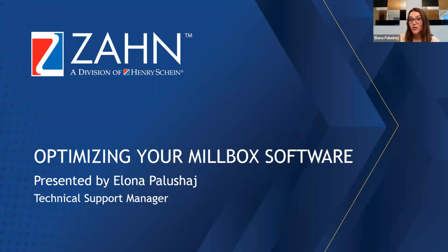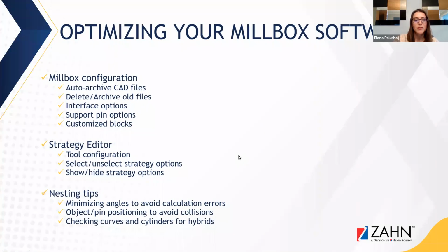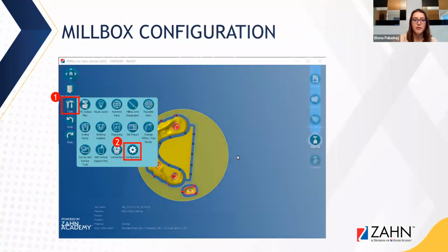And today we'll be going over a few features in MillBox. Some are old, some are new. So hopefully they're useful for all the attendees. So we will start with going over the MillBox configuration.